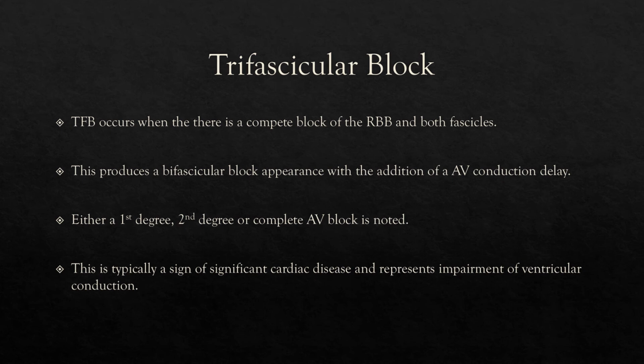Again, as I said, that's very common to have at least a first degree, and these will often be accompanied by a second degree or a complete AV block. And anytime you see this, the patient either has a significant cardiac history or is undergoing currently some sort of cardiac event. It should definitely provide pause to the provider to really evaluate your patient and make sure we know what's going on.